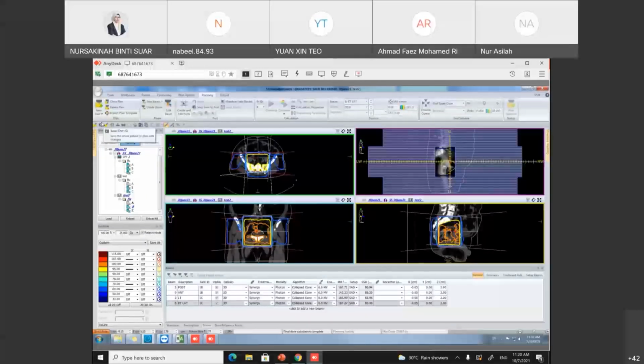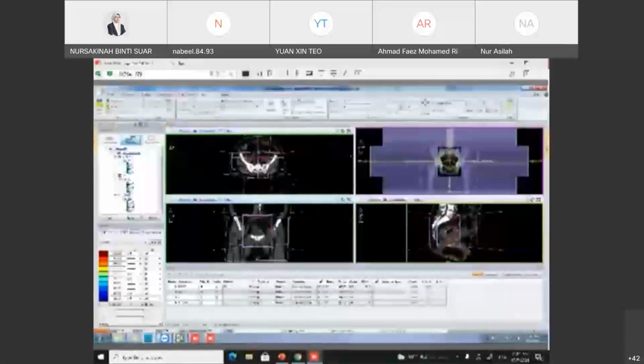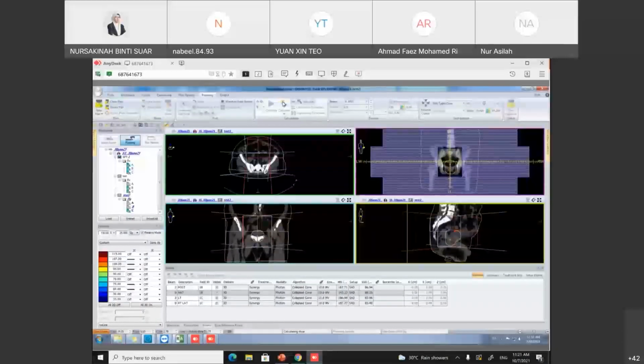Okay, this is the 6 MV, and now I change it to 10. It's a bit slow.